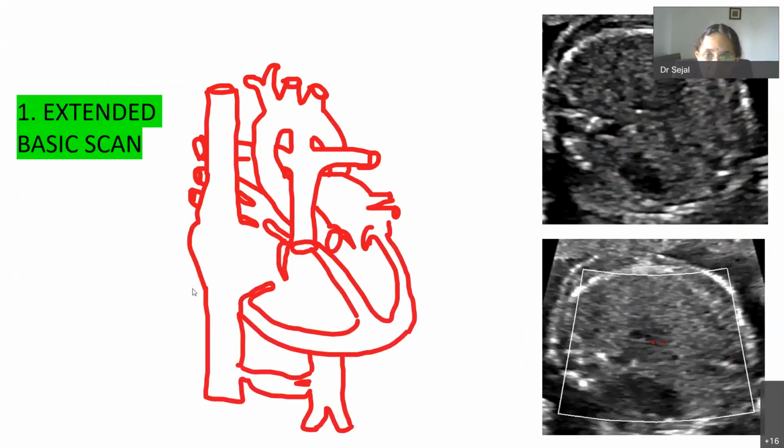Axial means what? In this picture, if I see, axial is this way. For example, this is axial. So the first most important view we will start with is the situs. Situs is where you have an axial cut which cuts the aorta and the IVC this way. This is very similar to our subcostal view where we start at the level of the diaphragm.